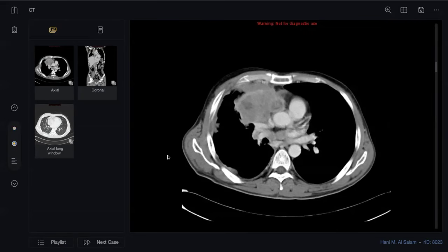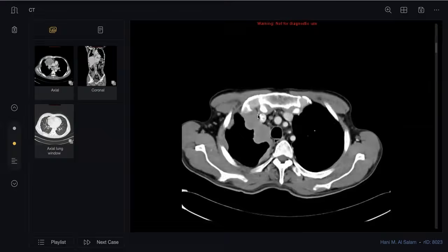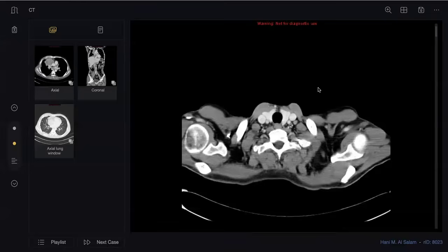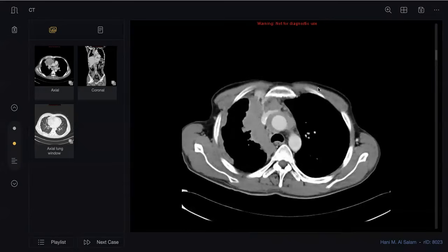Okay, so I've been presented with, is it a scrollable image or a single image? You can ask for control. Okay, so I've been presented with an axial intravenous contrast enhanced computed tomogram of the chest of the previously seen patient. This is in mediastinal window, so I'll just scroll through from top to bottom and organize my thoughts before giving my findings.